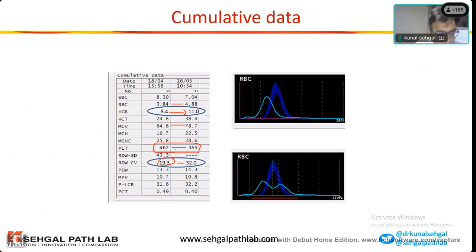Just because platelet count is high, do not leave it alone. You need to check your smear and check whether it is matching. Check your histogram. Sometimes you can clearly see RBCs going to the platelet, maybe a false high platelet count of 7-8 lakhs. So you have to always check. Both causes are possible. Here what happened in this case was reactive thrombocytosis, which settled with therapy for iron and for the deficiency given to this patient.